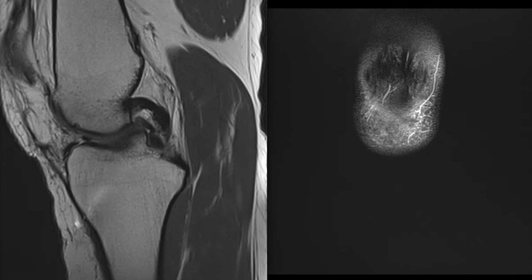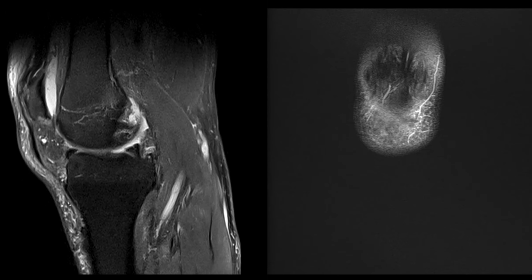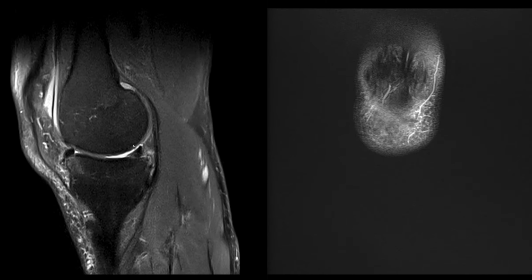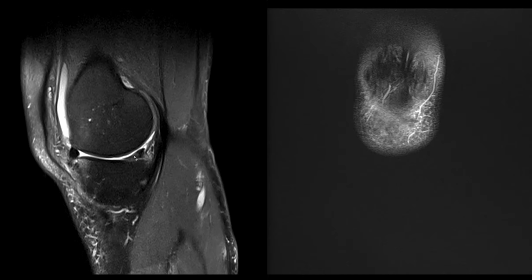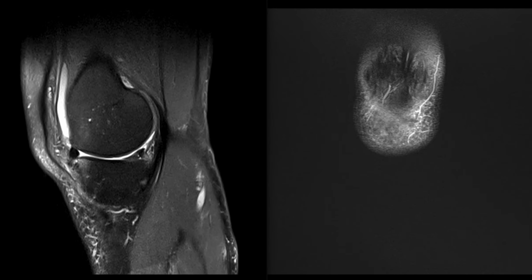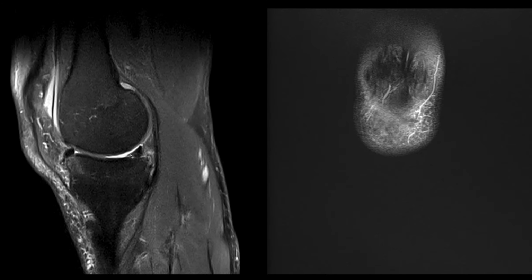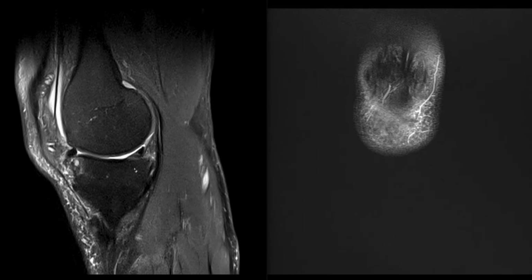In this next patient, as we scan through to the medial meniscus, we can see that the posterior part of the meniscus is somewhat attenuated. It is smaller than is normally seen. There is potentially a good reason for that. This patient obviously has some cartilage damage, and it's not uncommon as patients get older that the rim of the meniscus becomes worn and attenuated.